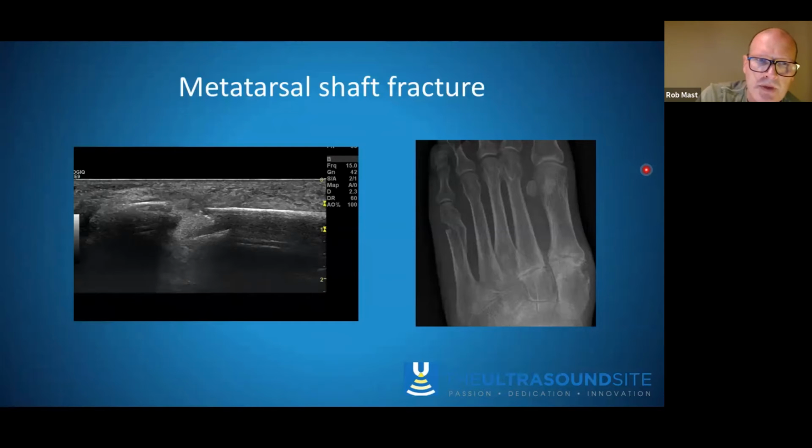But particularly if you've been scanning for a while and you start looking at patterns, and obviously with bones, you can often see two sides of the fracture. And sometimes if you scan around the bone, you can follow the bone in a three-dimensional direction, and you can actually see where the fracture is.